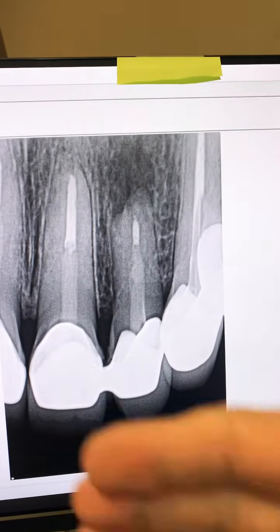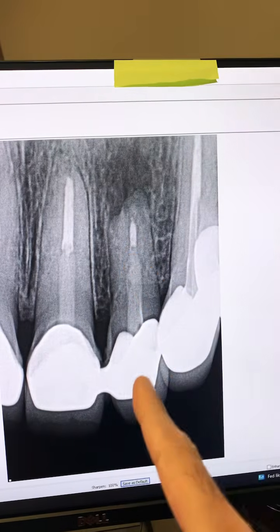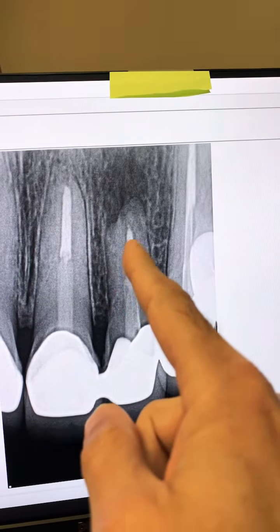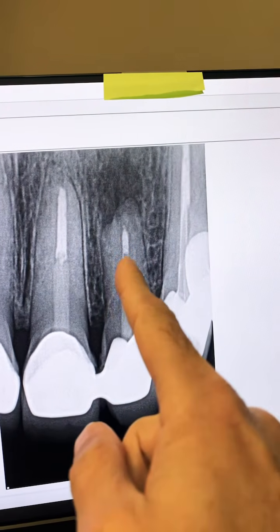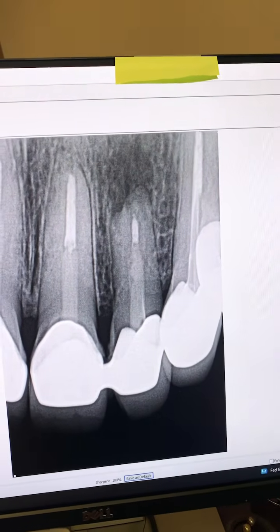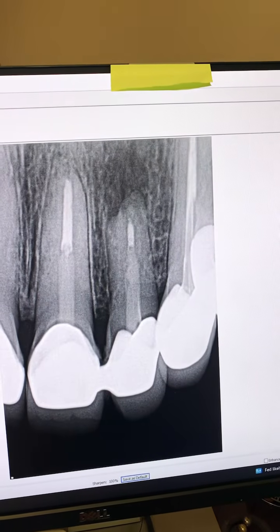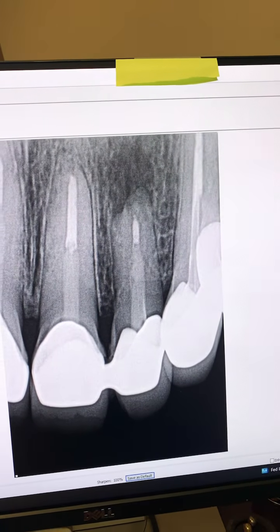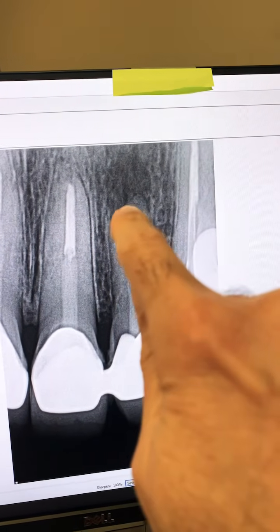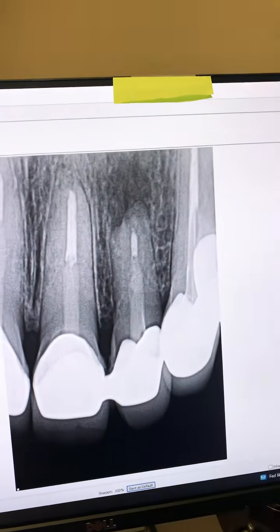We want to do that first, non-surgical retreatment first, and prepare the tooth for apical just in case we need to do apical later. Which means that if I non-surgically retreat this tooth, I will go through the fiber post. I use ultrasonics. I will remove this, whatever this is. I probably have to go through that as well with ultrasonics, and then do my instrumentation, shaping and irrigation, the 3-dimensional activation, of course, with 6% sodium hypochlorite, and then place an MTA plug, probably from the apex of the tooth to probably halfway.